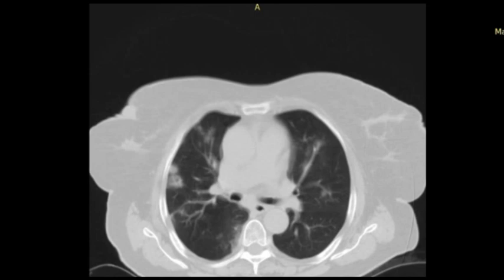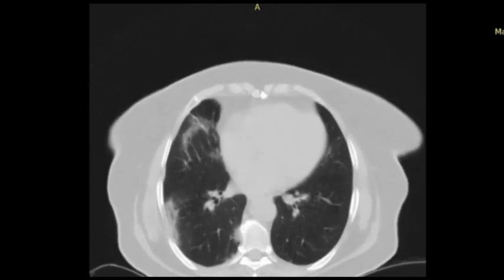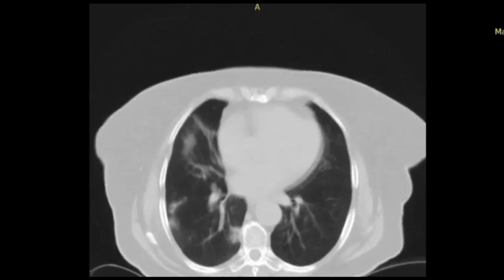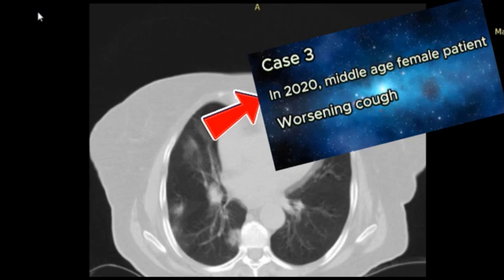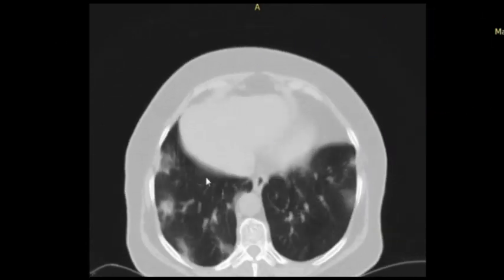My diagnosis. Any pleural effusion? No. Any lymphadenopathy? Clear mediastinum and no pleural effusion. At the top of my differential diagnosis, organizing pneumonia. Second one, chronic eosinophilic pneumonia. I will give you a hint. You've never thought of it, but it's been there from the beginning. Look at the date. Yes. COVID? Definitely. Yes, lower lobe, peripheral, without lymphadenopathy or pleural effusion.